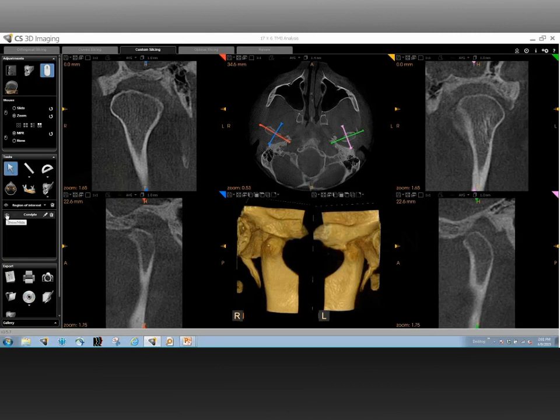With that said, let me bring this over to you, Dr. Kottal, and start with a question of, could you show us the anatomical landmarks to be noted on a scan of the TMJ?